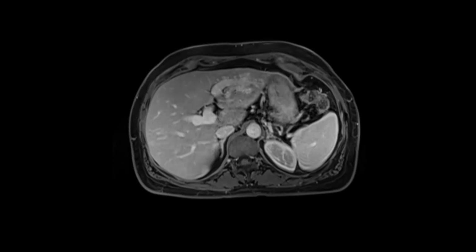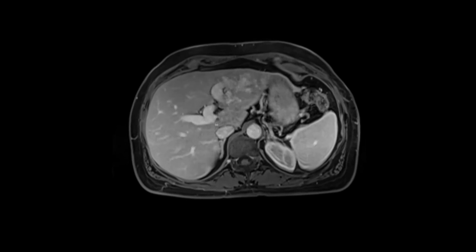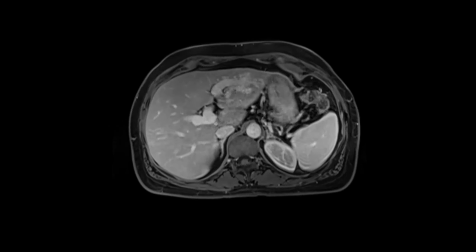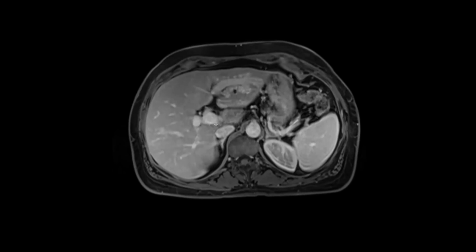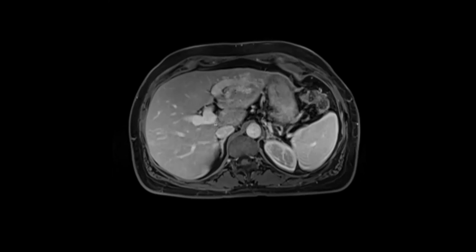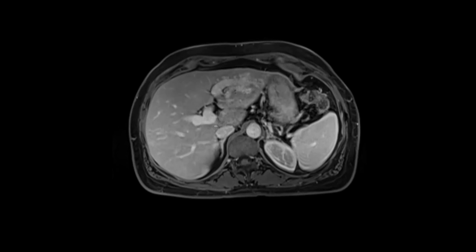It also looks like that left portal vein is large, like it's feeding this vascular malformation. It looks almost like an AVM or something, with hypertrophy of the left portal vein. That's something that we mentioned here. I agree. Yes. So this was an interesting case, and it shows the helpfulness of MRI in problem solving.